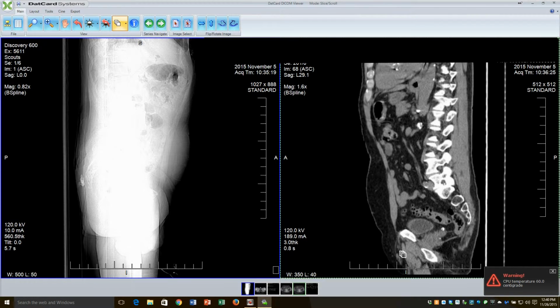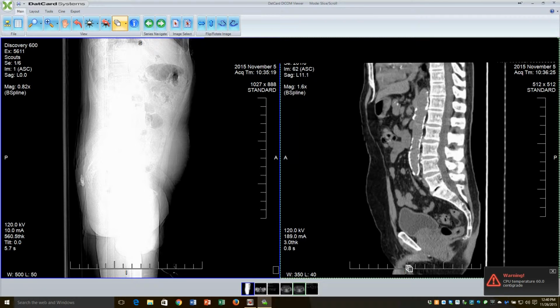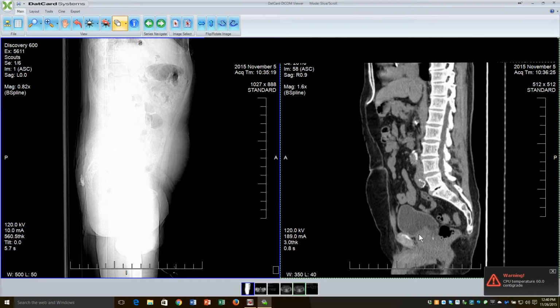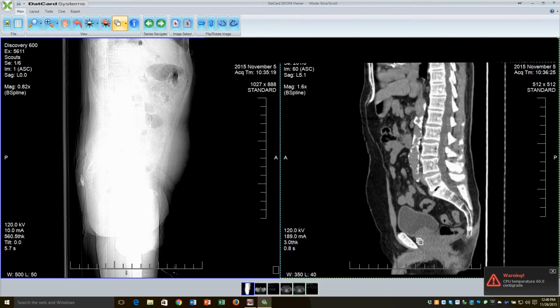And now let's take a look at the hernias. They don't show up well here on this. Pretty generous sized prostate gland. This is a pretty good sized gland here. So I wouldn't be surprised if he has problems urinating.